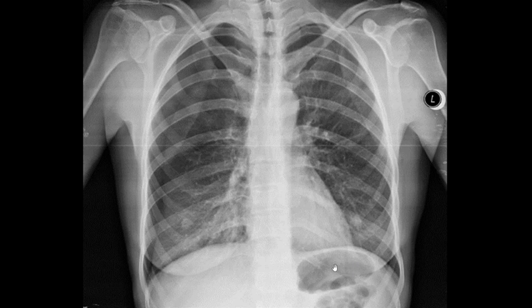Also, here we see something many people, even many doctors, often wonder about. This is normal air in the stomach, in the gaster. So normally, physiologically, we have some air in the stomach, and this is the air bubble in the stomach. And here is the diaphragm. The diaphragm is going all the way to the ribs. This is the costophrenic angle: costarum are the ribs, phrenic is the diaphragm. It is important for it to be dark and sharp like this. So this is a normal lung field, obviously.